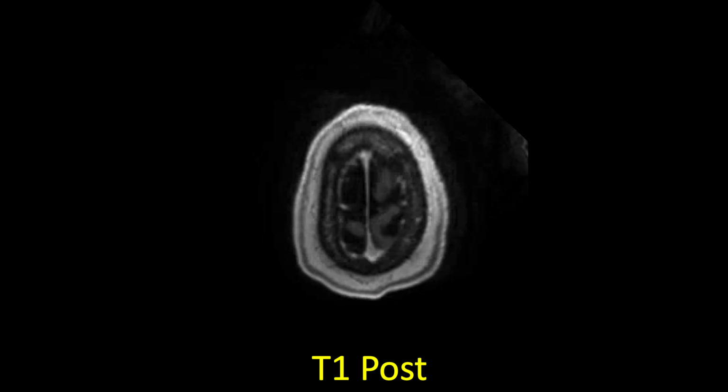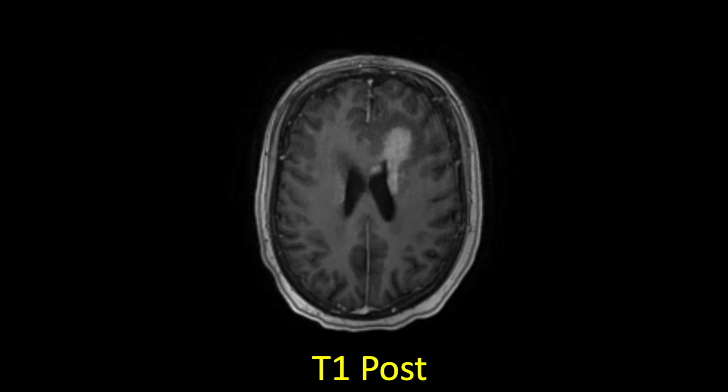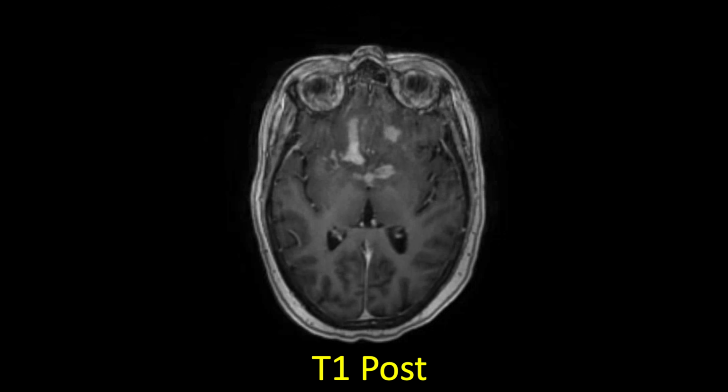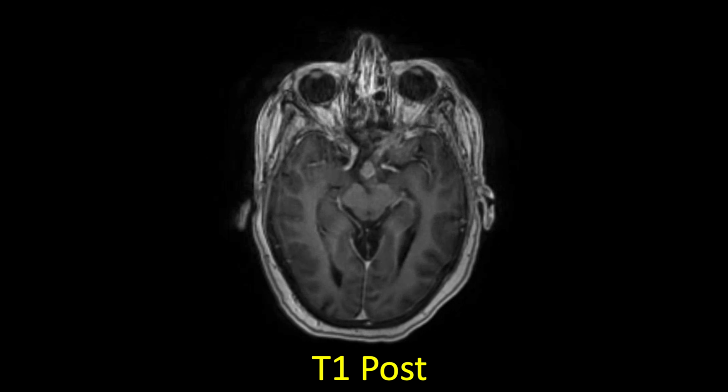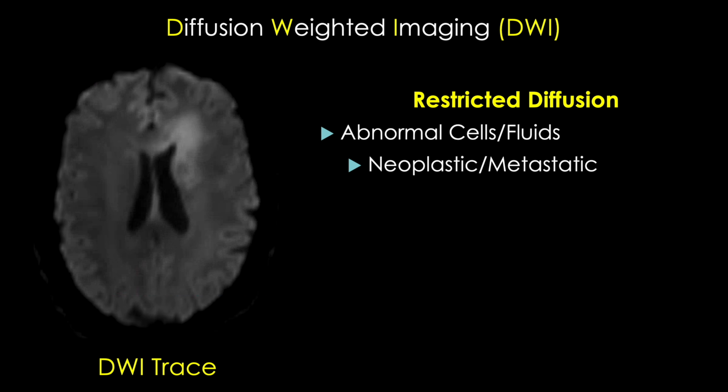If we look at the T1 post-contrast images, you can see there is abnormal, homogeneous appearing enhancement within these regions, and a little bit of mass effect, but not a ton. This is the classic appearance of CNS lymphoma, an etiology you should always consider if there's a homogeneously enhancing mass with restricted diffusion within the brain.